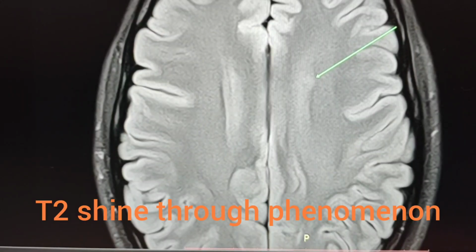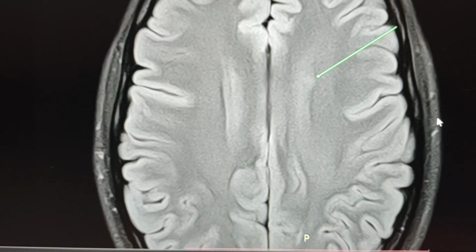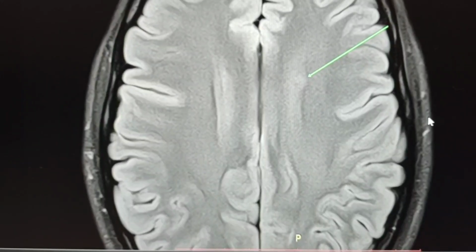This is a case of a 23-year-old young female patient with chronic headaches, and as an incidental finding I found this one. This is a T2 FLAIR image. We can see a slight increase in signal intensity in this region.